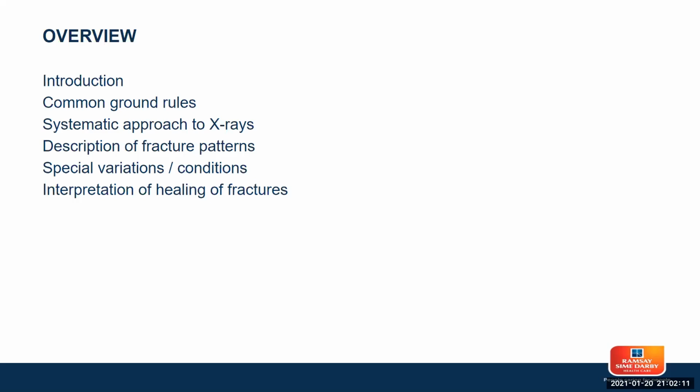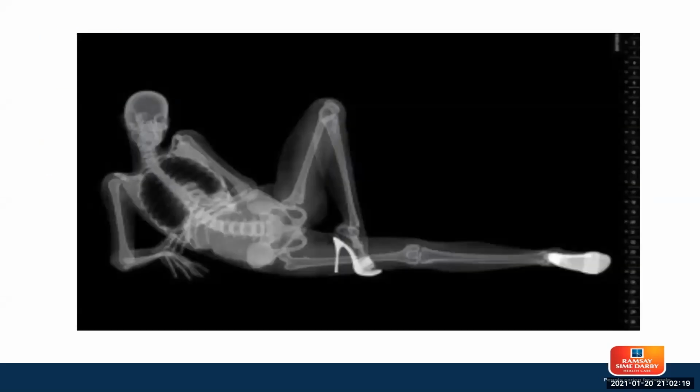Okay, so it's not as, to me, I find reading ECGs a lot more complex. So anyway, this is just generally an X-ray. So how do you identify a fracture on this? Strangely enough, this is from a calendar for radiologists, would you believe? I don't know, radiologists are strange people. All right, this is not what it is.